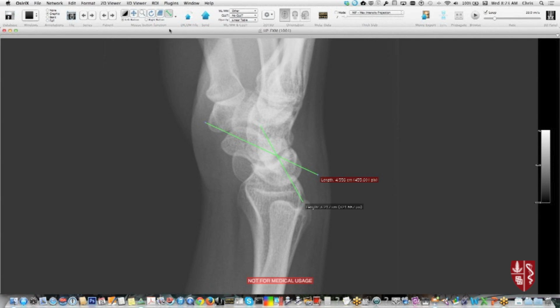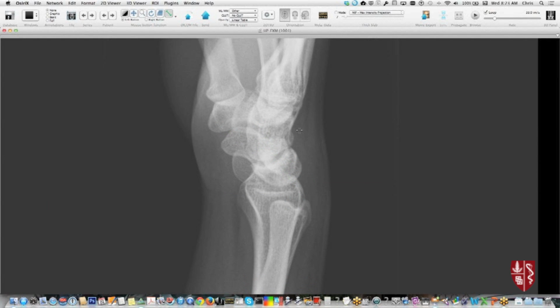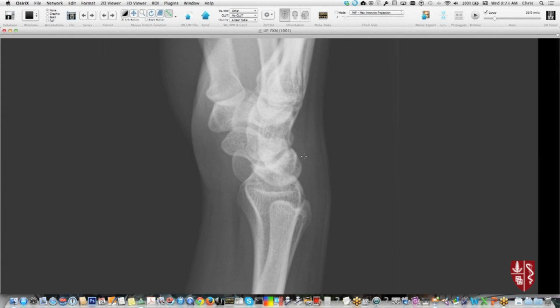And that's a VISI, volar intercalary segment instability type pattern. Compared with the scapholunate one, this goes along with lunotriquetral ligament deficiency. So scapholunate ligaments are in here, lunotriquetrals in here, and you can see the lunate and the triquetrum are malaligned right there because the ligament between them has been disrupted. And one of the best clues for that is on the lateral view here.